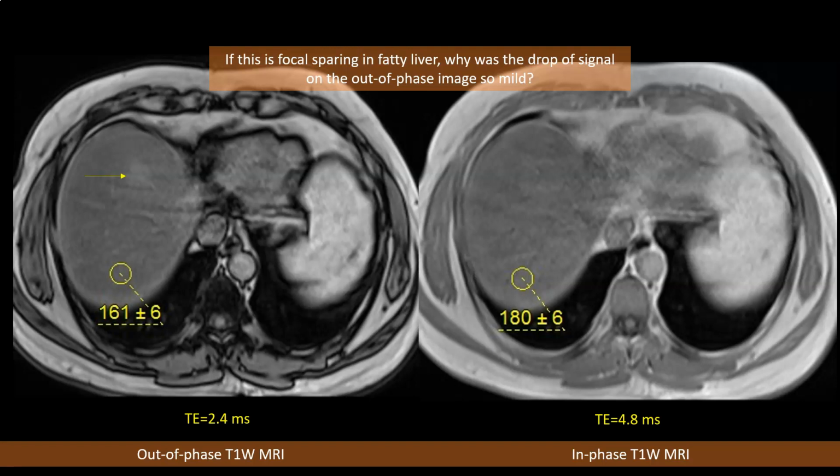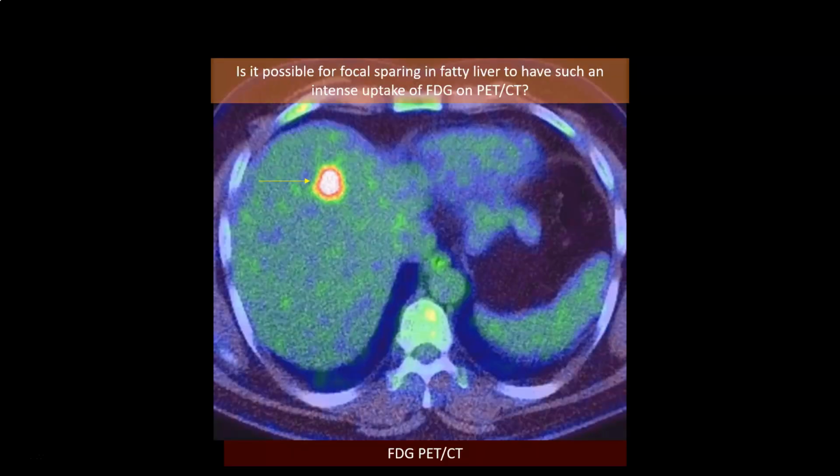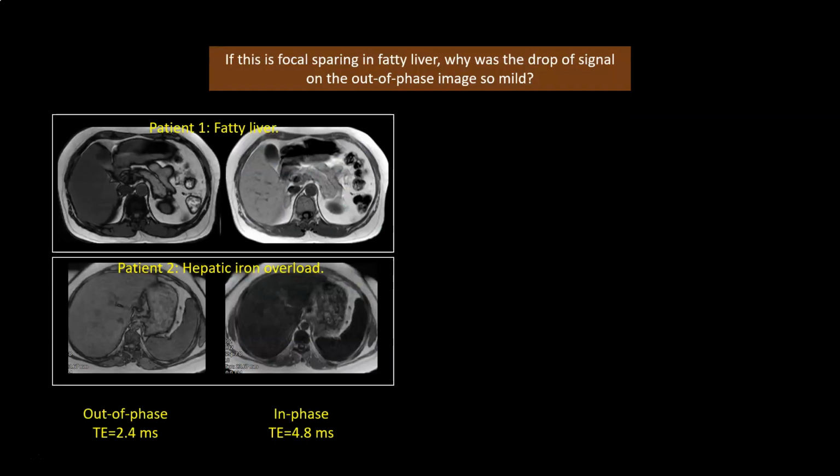First, if this is focal sparing in fatty liver, why was the drop of signal on the out-of-phase image so mild? We have here a drop from 180 to 161. This is something like 10% drop in signal intensity. The second objection, if this liver is fatty, why is it measuring 54 Hounsfield unit on unenhanced CT? Third objection, is it possible for focal sparing in fatty liver to have such an intense uptake of FDG on PET-CT? Let us think of these objections one by one.